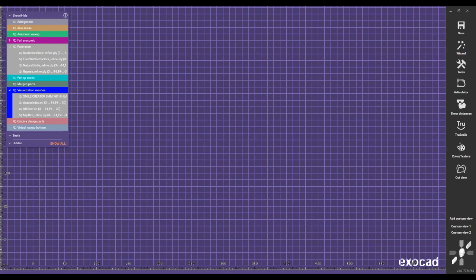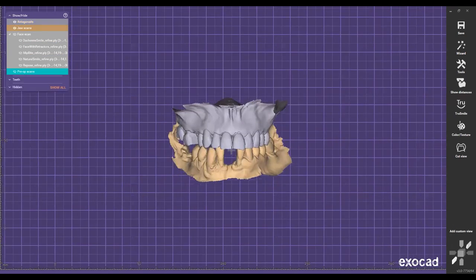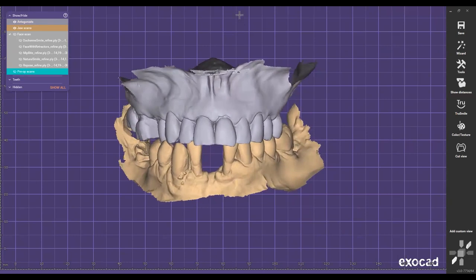Basa, let me know if you can see this, upper and lower jaws right now. Are you able to see that? So otherwise I can stop. I can see if I can share. Let me share this one right here. So are you able to see this, the upper and lower models? So let me see. Okay, clear now.